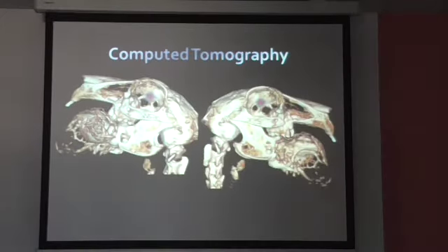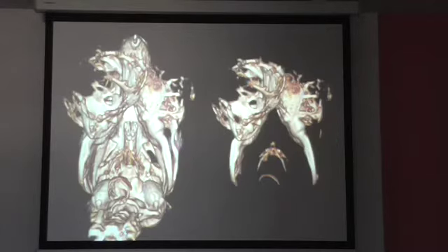And here you could see 3D reconstruction. This is good to show the client. I will not go to surgery in this rabbit, because if we would like to be perfect, we need to cut the lower jaw here, and it's not possible.